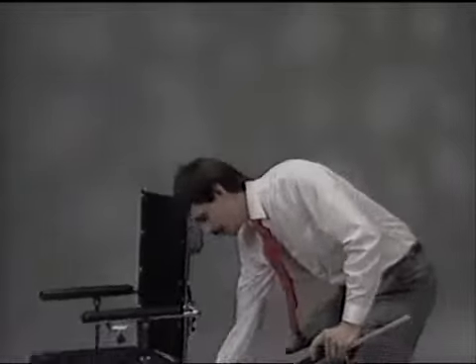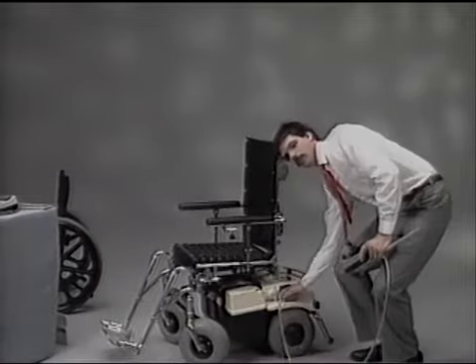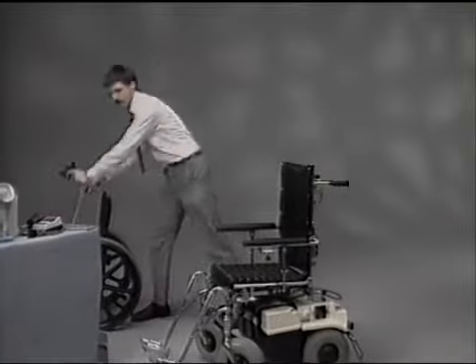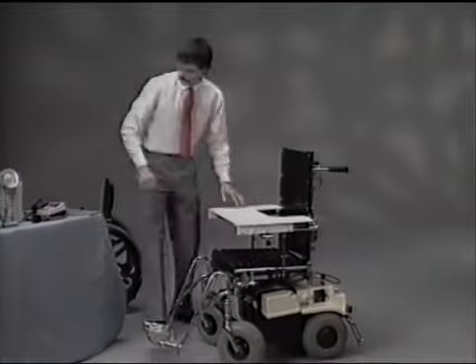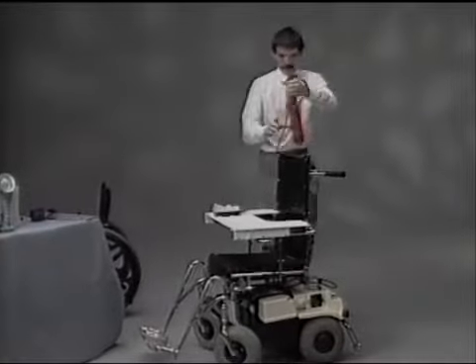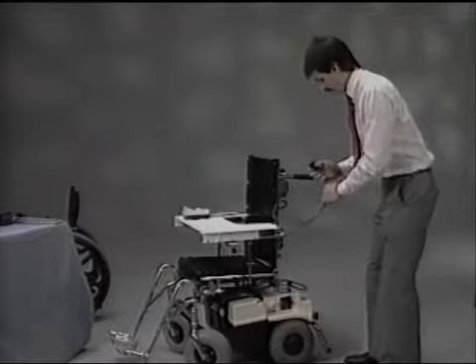The control is called a microswitch control. So what we're going to do right now is change this chair around to operate with a microswitch control. This particular chair is very easy to do that with by simply removing this joystick we have in here now. We can set that over here. And we're going to place a lap board on here that will give me an opportunity to put some other things on here. And here's a box that will allow me to plug a number of different types of joysticks into this chair.